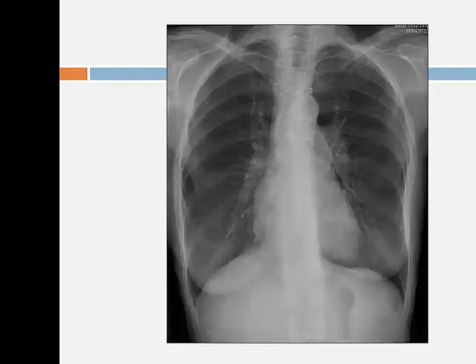Okay, so normal or abnormal? So they've had a sternotomy. Normal or abnormal? It's going to be usually abnormal if somebody shows you it in a slide, isn't it? It's a bit boring showing you a normal film. But do you see the pulmonary trunk here looks a little bit prominent? And even the pulmonary arteries here are a little bit on the big side.